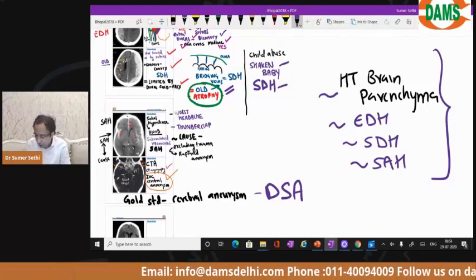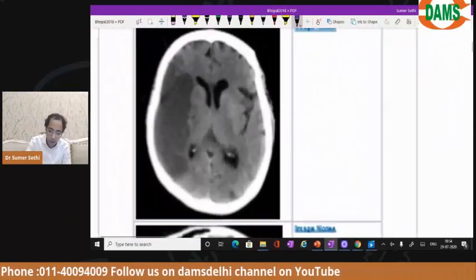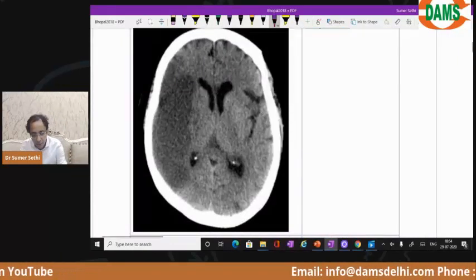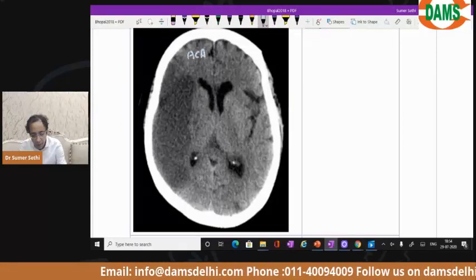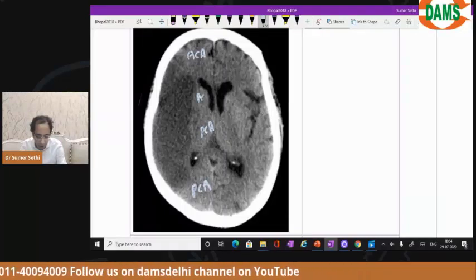Now once you are able to follow this, I want you to see an image with me. बच्चे आप, मैं चाहता हूँ सभी बच्चे देखें. I want you to follow an image and tell me, okay, this was your ACA territory, this is your PCA territory, okay, ACA territory.